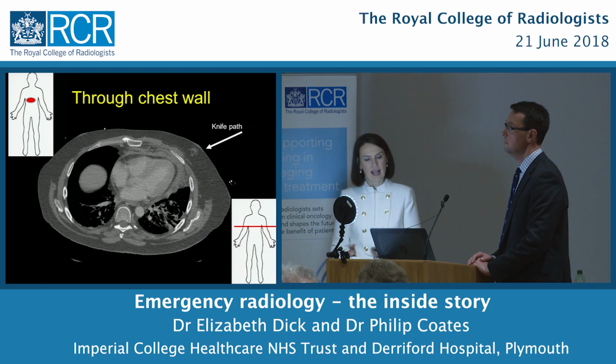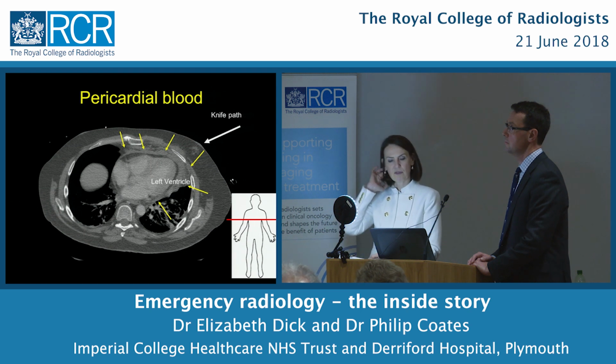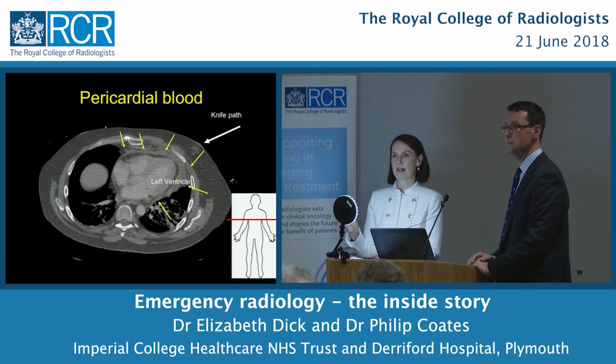That's the question. And if we now look around the heart, so remember the heart from when we looked at it before, there is all of this extra blood. Okay, so that's obviously bad news to have blood around the heart. The good news is that the knife hasn't gone into the heart. So we've got to keep thinking about where the knife may have gone next.